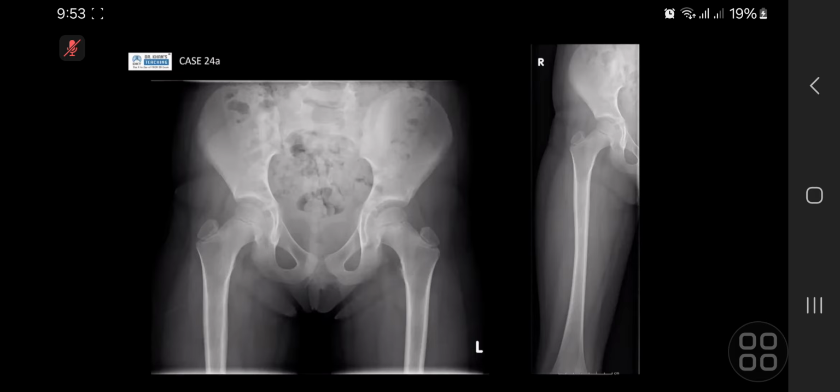This is a frontal radiograph of the pelvis with a single view of the right hip. I'm looking at the bones. There is an avulsion fracture of the left lesser trochanter of the femur. The rest of the bones appear normal. The tissues appear normal.